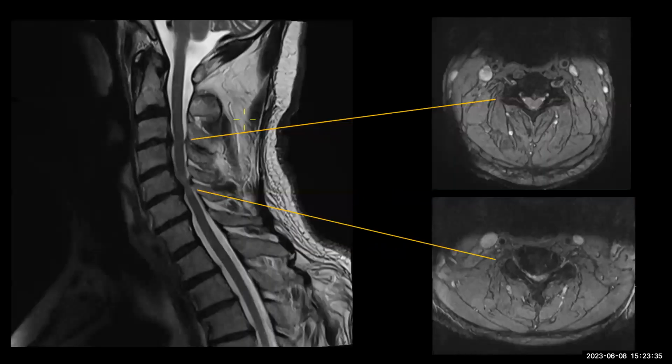So that usually holds for the lumbar spine. But when we're discussing the cervical spine, you more likely are going to encounter disc osteophyte complexes. So it's not just the discs alone, it's part of the osteophytes coming from the vertebral bodies. And you can see that we talked that the conical triangular top is C2.